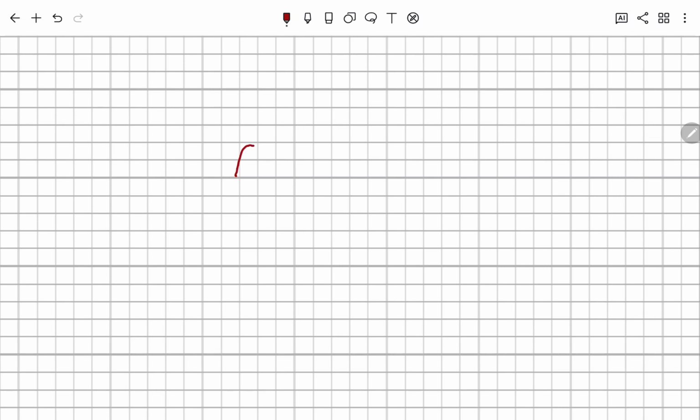If we draw it like this, its height is less than 2.5 small scales, that is equal to less than 2.5 millimeters, right? And its width is less than 2.5 small scales, that is, it should be less than 110 milliseconds, right? So what if the height is increased?